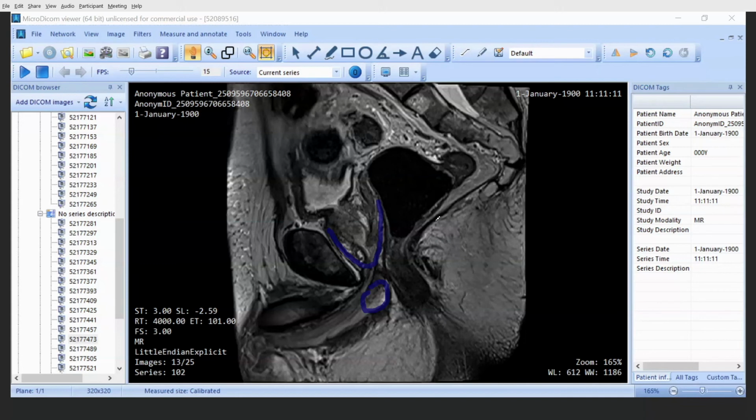So if I see that there is a bowel in one place or a bladder in one place, then I know that there cannot be microscopic disease in that area. So the CTV basically just asks you, could there be microscopic disease in that area? Now, if you are concerned about mobility of the bladder and mobility of the bowel, etc., you can play with your PTV margin.